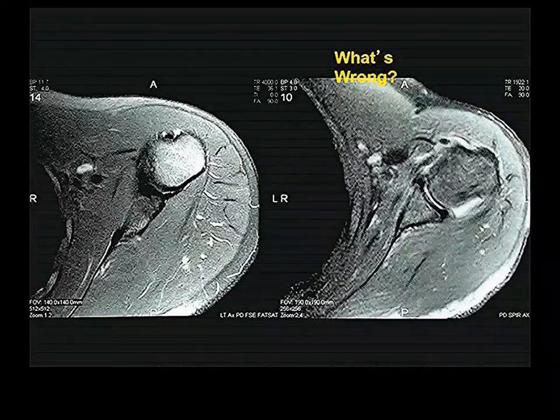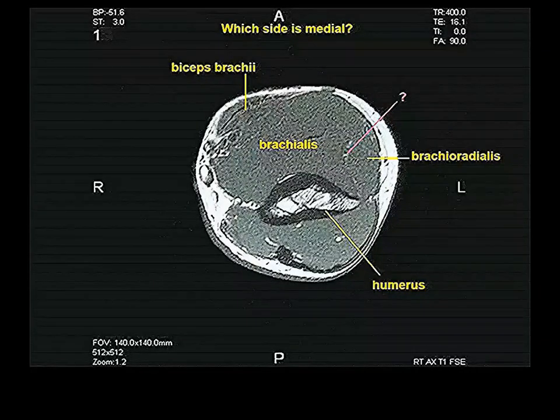This is a displaced tendon of the long head, which happens during some shoulder traumas, because it's usually held in place by a band which extends from the subscapularis tendon. If there's a tear of the subscapularis muscle, that band will tear, and that will cause a displaced long head tendon. I don't want to spend a lot of time on this, but you can study these on your own.